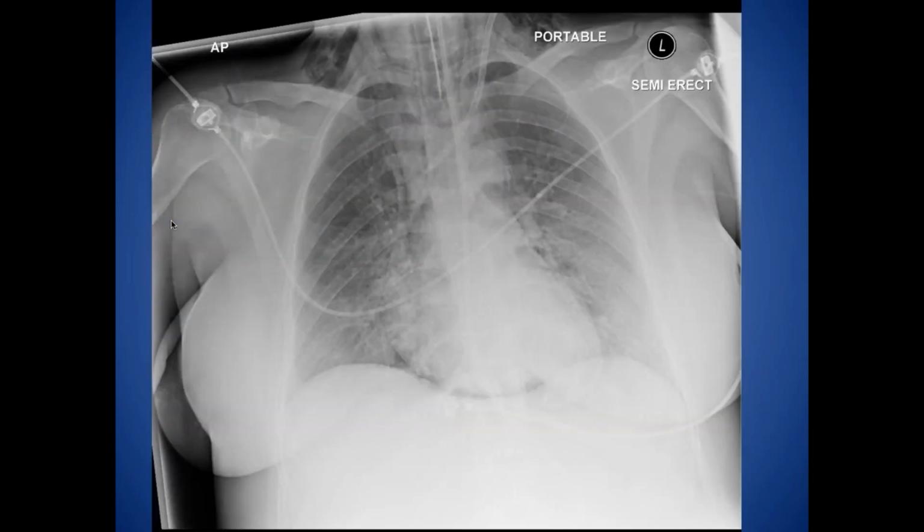Here's another example of the continuous diaphragm sign in ITU. So the patient has an ET tube in situ. They're on a ventilator, and the positive pressure ventilation causes barotrauma, which causes pneumomediastinum. Note also the surgical emphysema.